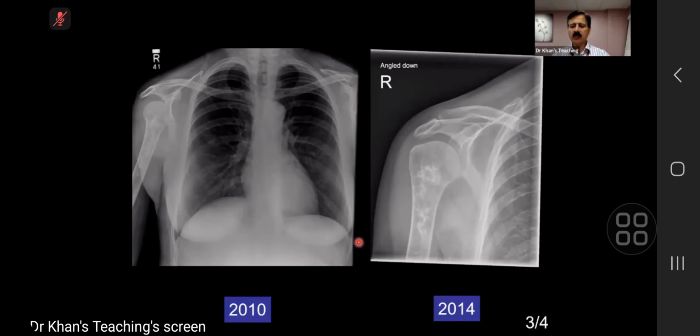And what happens is when chondrosarcomas develop, they start, I just remember it like this, they start eating up the calcification if it is a dedifferentiated type. So this lucency should raise eyebrows. There is a difference between old and new. What are you going to do next?